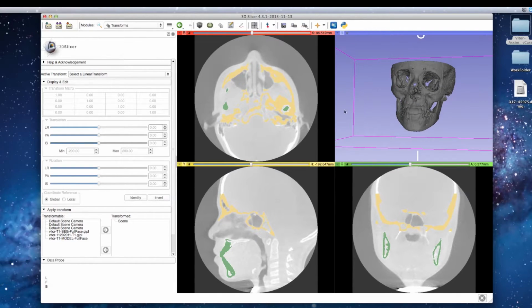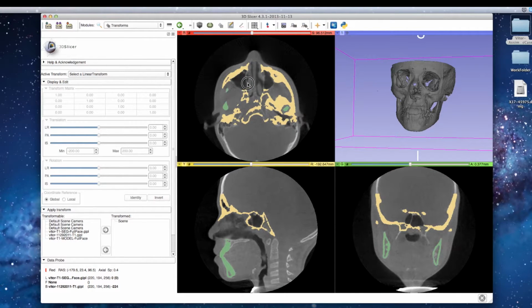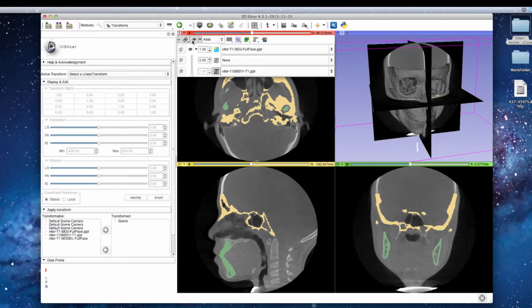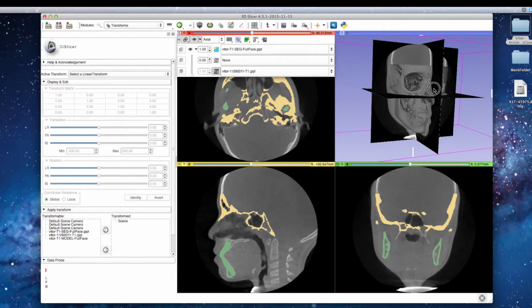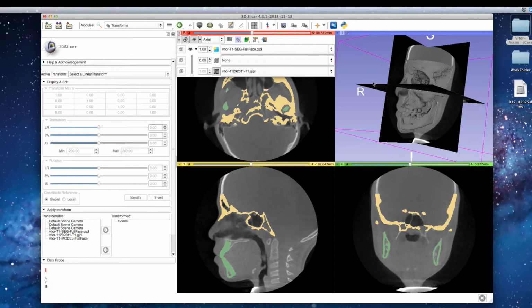To change the contrast of the volume, press and hold the left mouse button in any part of the window while moving the mouse cursor around. It is possible to see the slices of the 3D view by clicking on the eye icon in the drop-down menu. If you click on the ring icon to the left of the eye icon, all three views will be linked, and modifications will apply to all views.